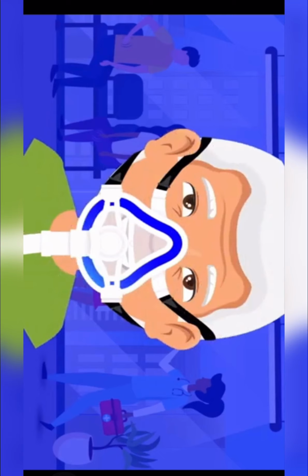Today we're going to go for a fast illustration of BiPAP, which is one of the most important devices used in the airway respiratory therapy zone.